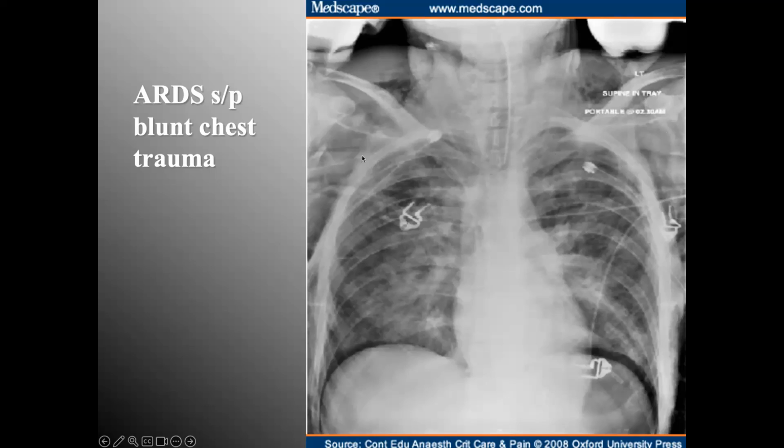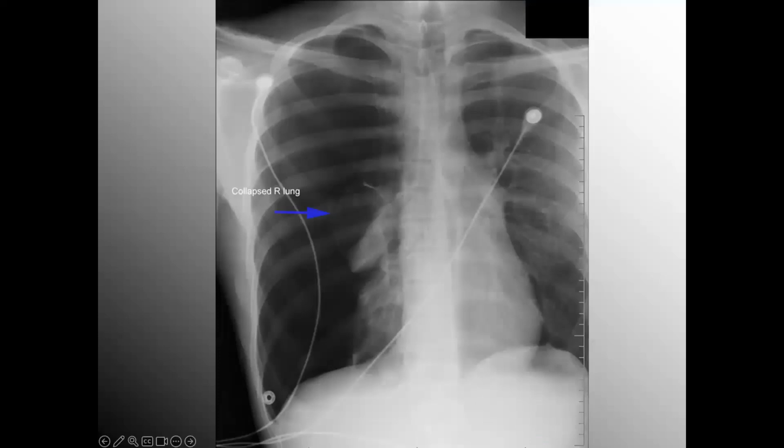That's never normal. So you've got air that's actually transected in between the pec major and the pec minor muscle. Also, you've got what's known as the deep sulcus sign. That sulcus should not be that delineated all the way down into the pelvic region. We have free air here that's dissecting out the lung tissue from the diaphragm. They should always be in contact with a thin portion of fluid, but never separated as you see it here with the air. So take a moment just to kind of take it in.